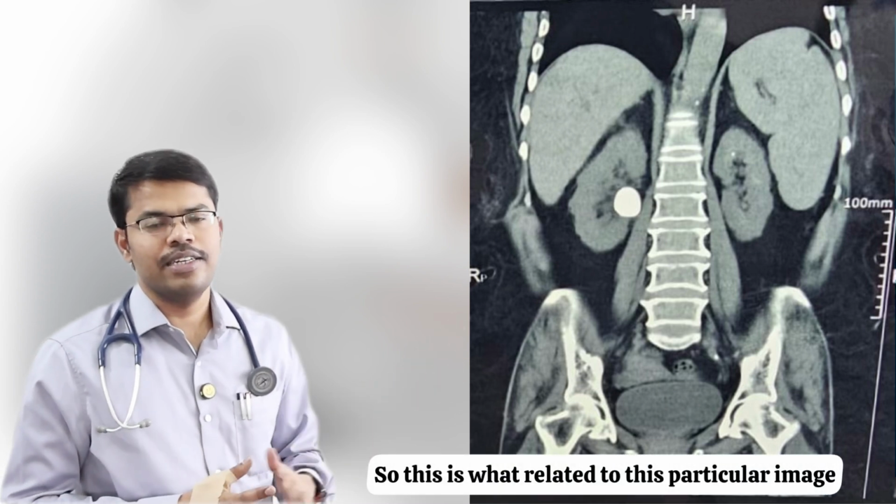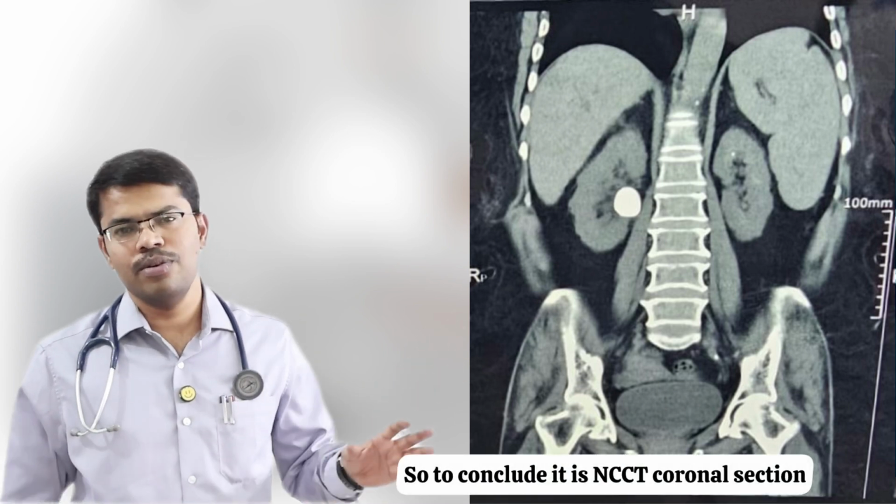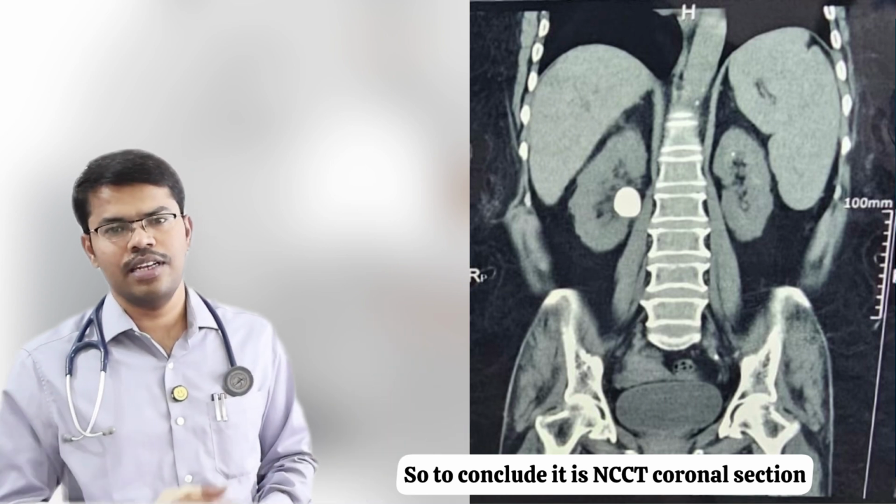So this is what is related to this particular image. To conclude, it is NCCT, coronal section, a big stone in the pelvicalical system without much hydronephrosis.